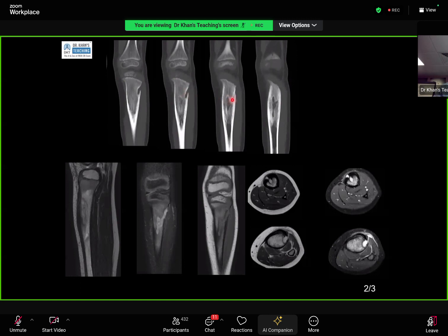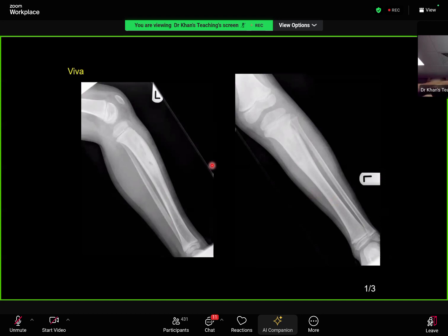It is going in the medullary cavity, and of course the same finding on MR. And then you can see this cortical breach, and you did very well, where there is a sinus tract and perifocal abscess. Well done. Another case of osteomyelitis. But my main idea was to show you cortical tunneling, which is not visible to you because of the projection or the quality of the X-ray. Well done, candidate 2.